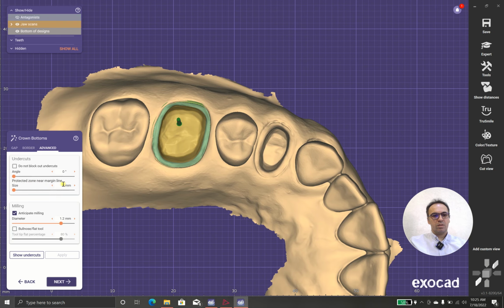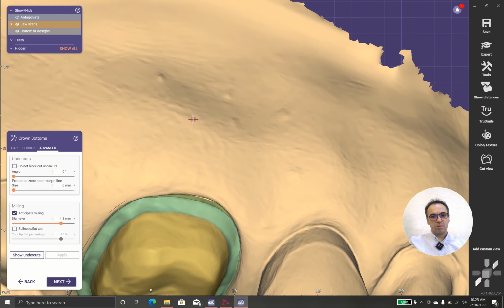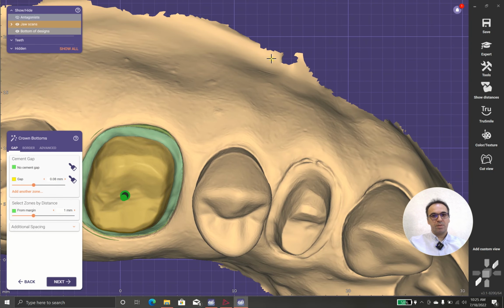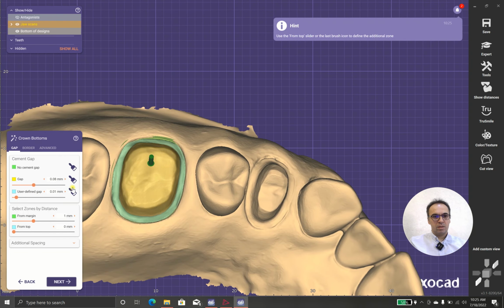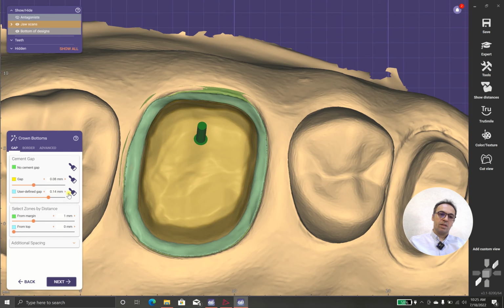In case that you turn the protected zone, you have problem with some gaps. I prefer to have gaps, but not having problem with result that is not sitting.